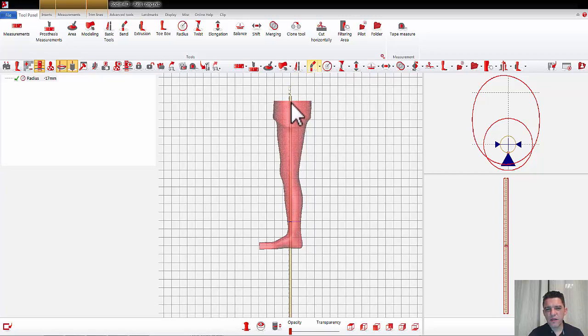This part is not important if you leave it completely straight, but if you want to bend a little bit, put it approximately here, and after bend to go back, and after the ankle, you can do it. The most important thing is to understand that in AFOs and KAFOs, you will have levels, and all the levels, you can imagine, you have here the reference of the blue line.